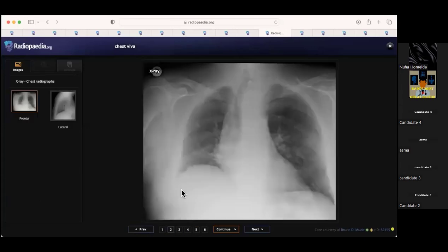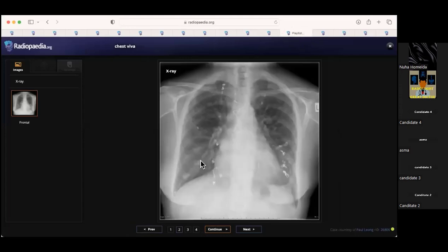And this case here is, again, unilateral interstitial changes. And we've discussed apicobasal, so that's the giveaway that this is a UIP pattern, but the other lung is normal. So always think that there is a lung transplant. And that was a case of Osler-Weber-Rendu.